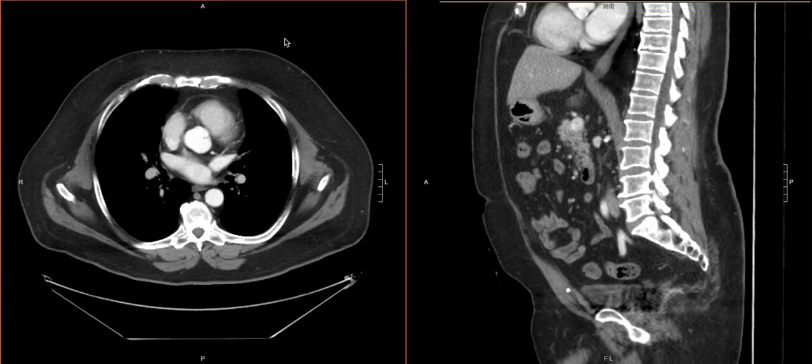Now that we're ready to actually start reading through our search pattern, what we're going to do in this video series is do a search pattern that goes outside in. So we're going to start with the subcutaneous tissues, and then we're going to work our way inside the body.